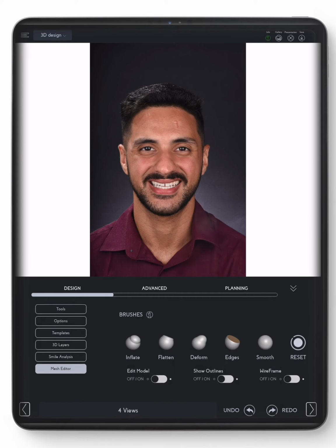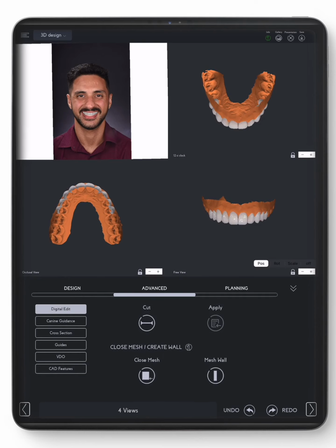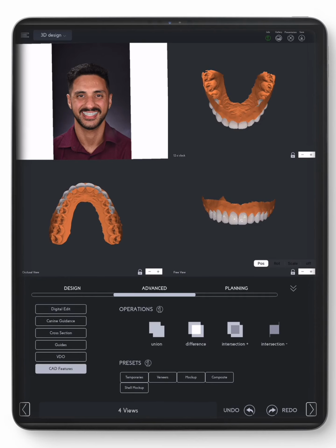Our AI technology speeds up the process but also gives you the option to make your own decisions regarding teeth templates, mockup format, motivational or ideal design, 3D design with ortho simulation, and much more.